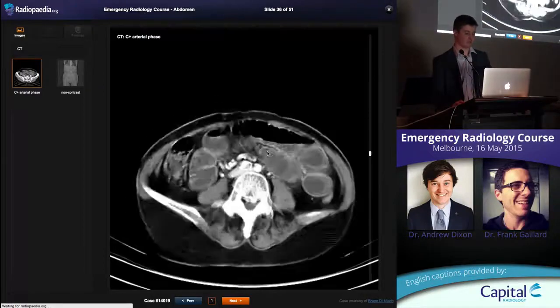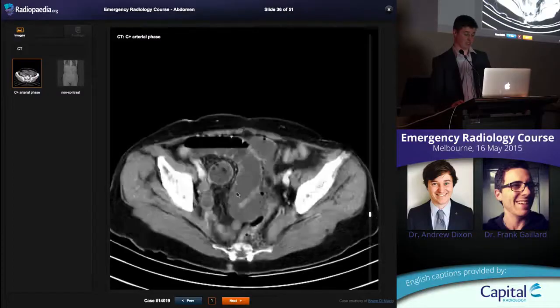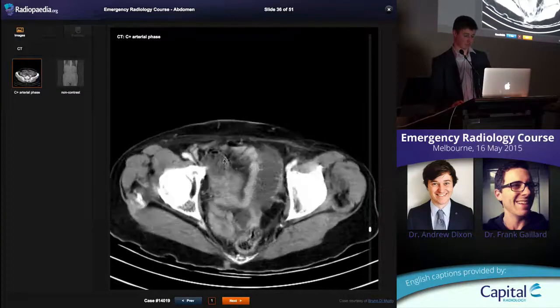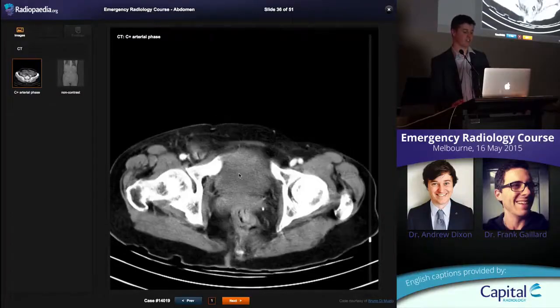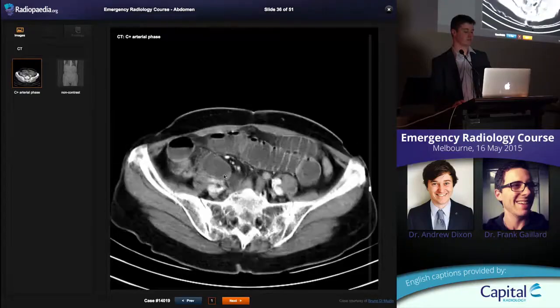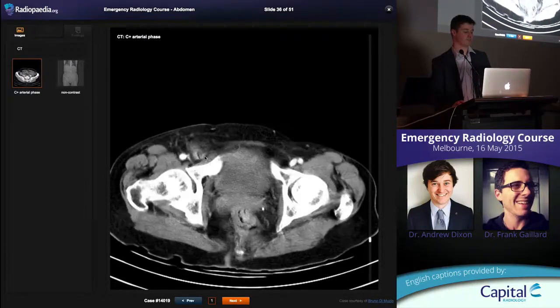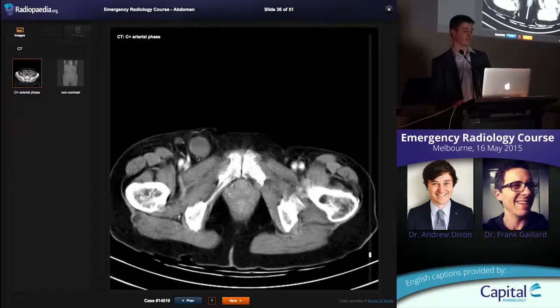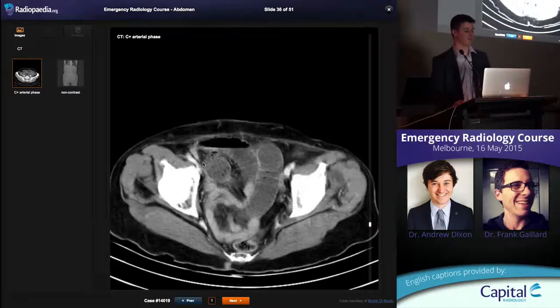Distended loops, completely collapsed loops down here in the pelvis, heading back to the cecum. Okay, so you know there's going to be a transition point. Looking in your hernial orifices. See this fecalization of the small bowel here? It starts to get little locules of gas within it, just before it heads into this femoral hernia, and then you've got collapsed loops coming out of it, okay?